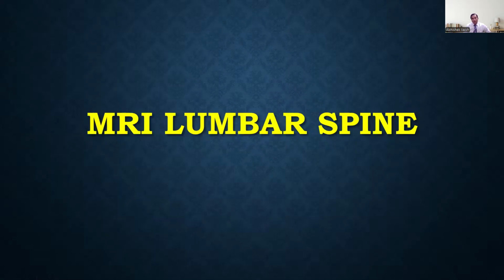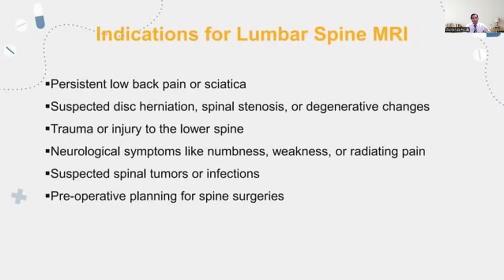Now, briefly talking about the MRI of the lumbar spine. So, what happens? How do you read a spine MRI? First of all, you should have a good indication to do an MRI of the spine. When do we order a spine MRI?